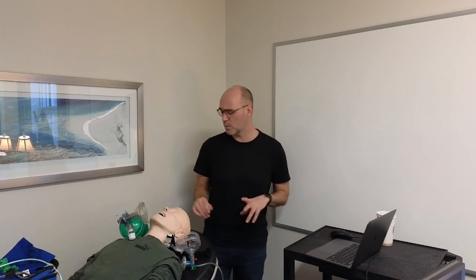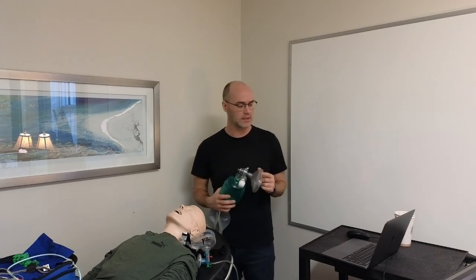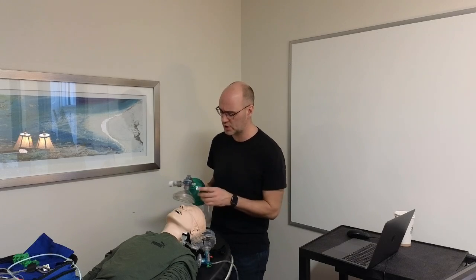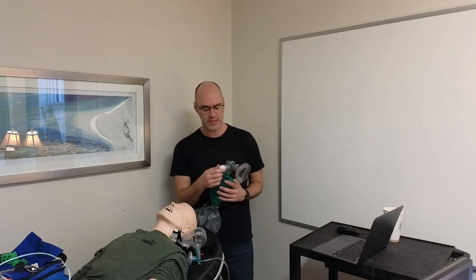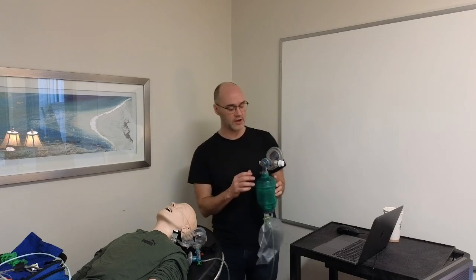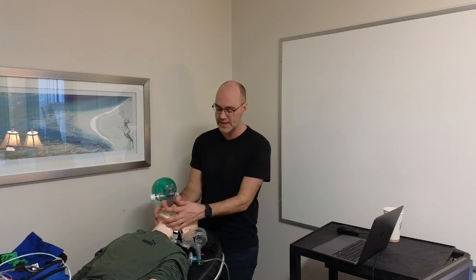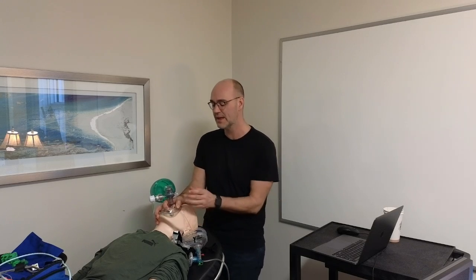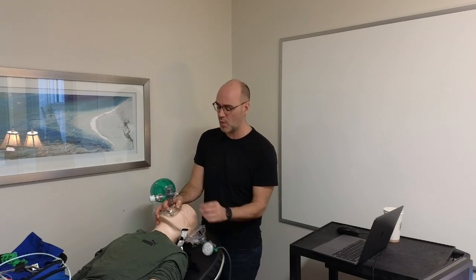Now, there's a way of providing CPAP that Scott Weingart of EMCrit advocated, and that has been published in a number of journals. It uses a high flow nasal cannula at about 15 liters per minute of oxygen, setting your PEEP valve on your bag valve mask, and then holding that over your patient's face. That will build up pressure, also helps make up for leaks inside of our system, and will function like a CPAP mask in the same way.